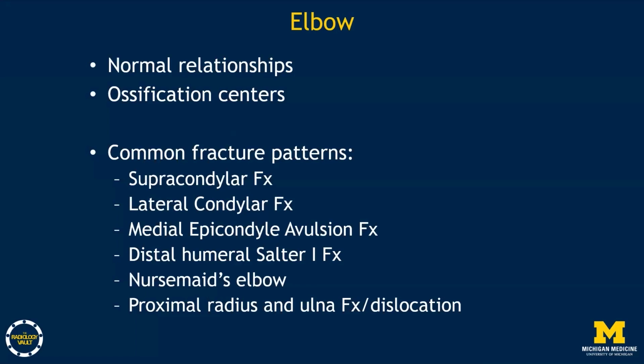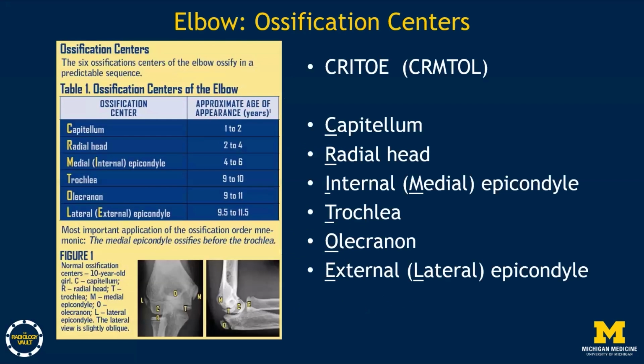At the pediatric elbow, it's important to know normal relationships, the normal ossification centers, and understand that there are common fracture patterns that we commonly see that aid us in making the diagnosis of fractures. And we'll go through each of these patterns in this presentation.